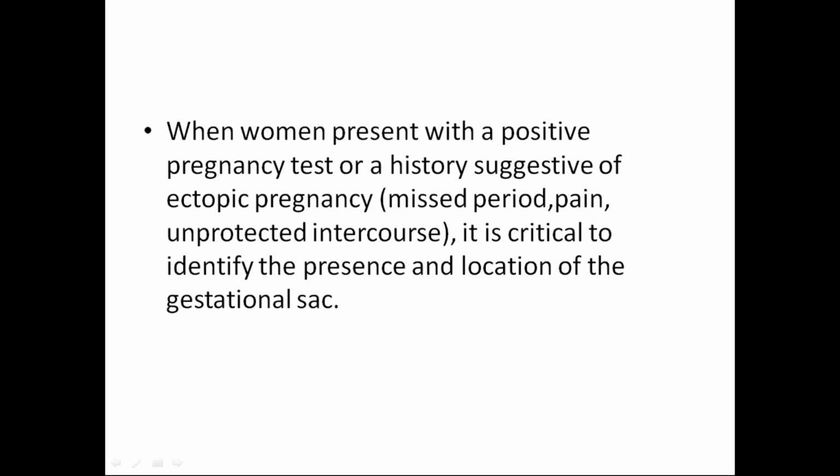This is another important emergency, which is ectopic pregnancy, where the patient deteriorates very fast and needs to be identified and operated on immediately. Here the woman presents with a positive pregnancy test or a history suggestive of ectopic pregnancy, which is a missed period, pain, unprotected intercourse, and it is critical to identify the presence and location of the gestational sac.